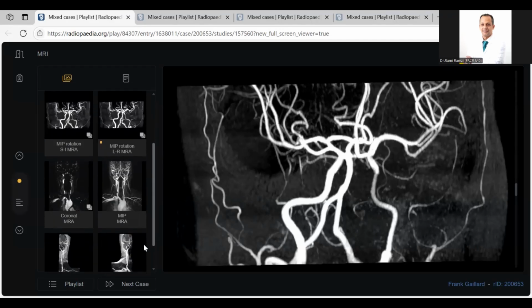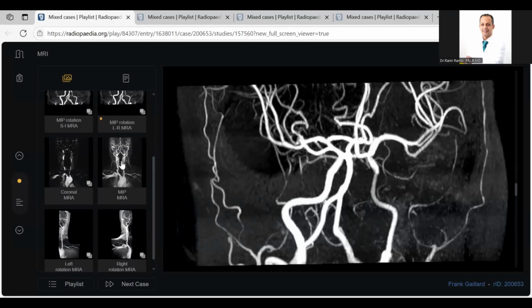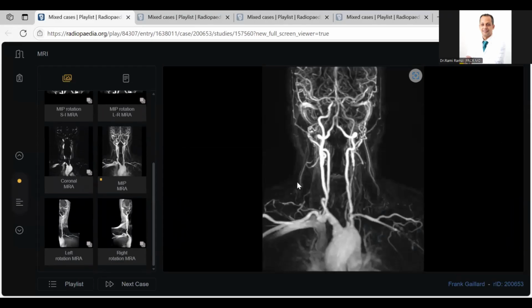If I told you this is neck MRA, would you detect any vessel abnormality? Yes, I can also see that there is narrow caliber of the entirety of the left common carotid from the origin, extending to. It's kind of got a beading appearance with focal areas of stricturing and narrowing. What else?